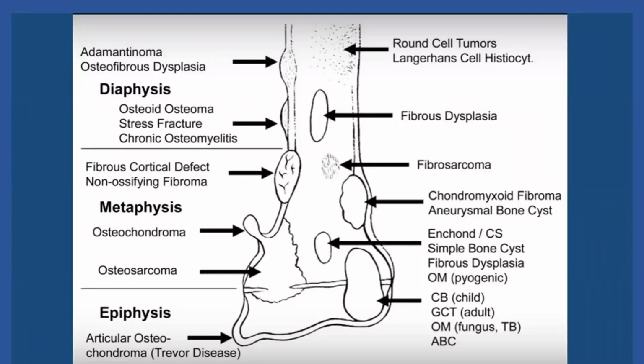If we know the location within the bone, we can say, most probably, if it's in the epiphysis, is it what? A giant cell tumor? Is it a chondroblastoma? Is it an eosinophilic granuloma? If it's in the shaft and the diaphysis, is it a Ewing's? If it's in the metaphysis, is it an osteosarcoma? These locations on plain X-rays help us significantly in identifying the lesion.